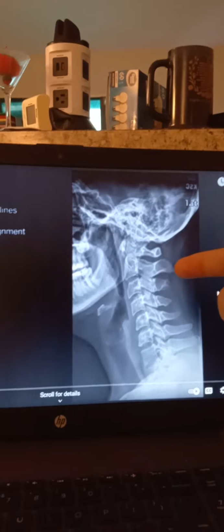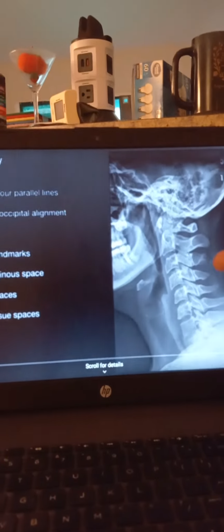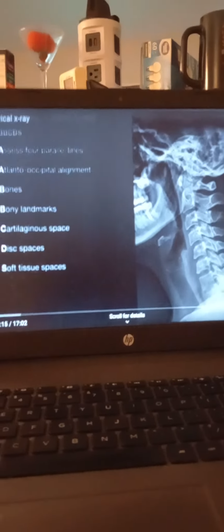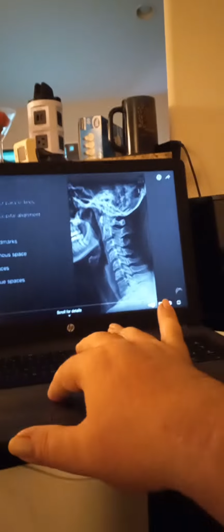All right. Well, this one here is a little lower. But see the back here? That's lower, mine's higher. So it's just a simple comparison. But is this person injured or not? What is their injury? I mean, we don't know, right? So let's go on and find out what's going on.